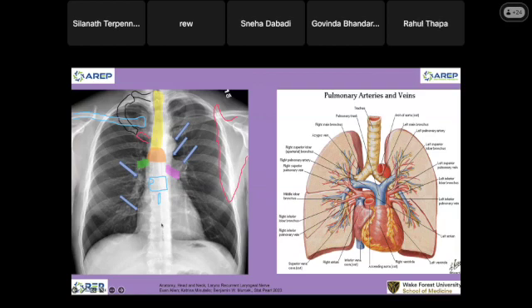And these parts, it's a right atrium. You can see below this is the fissure, the right lower lobe. So this is the right atrium where we talked about yesterday. This is the posterior costophrenic sulcus. If you see a double shadow, like something hiding in here, that may be the left atrium. In the lateral costophrenic sulcus, you can see the nice sharp shadows.